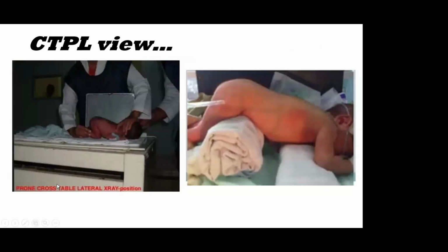You can hold the baby down, or you can even make the baby supported with linen, and you can give this position to the baby. It is popularly also called the position of sajda. If you've seen Muslims praying namaz, the sajda position is this position. If you want to remember it, the CTPL view.